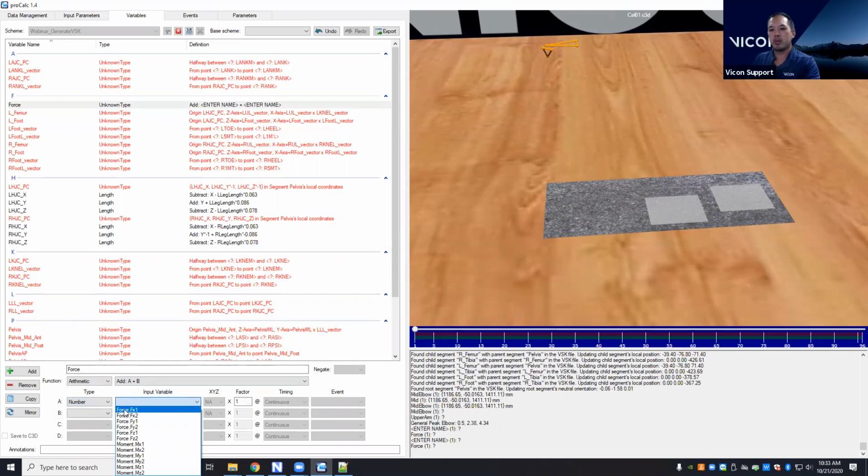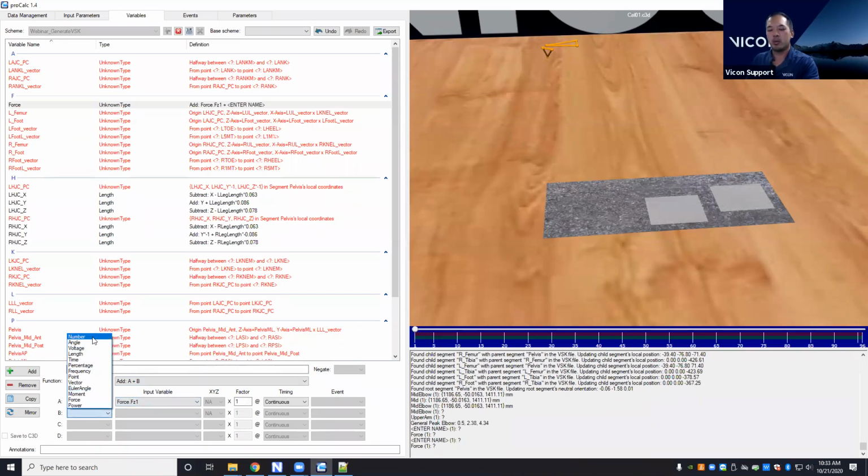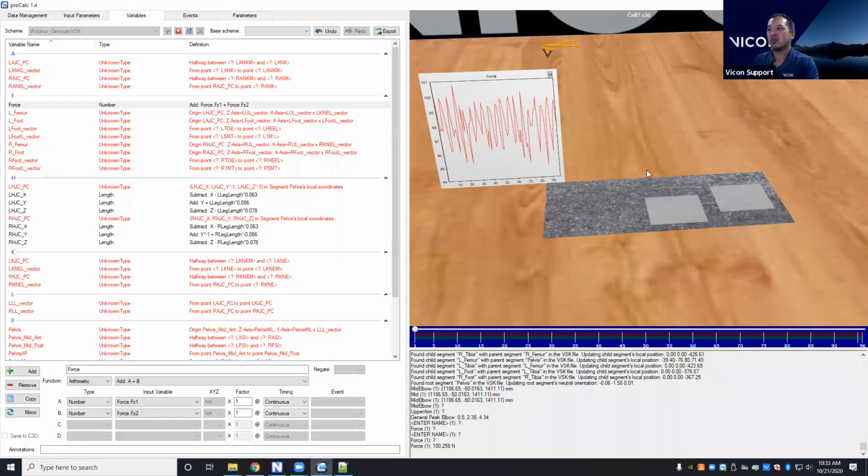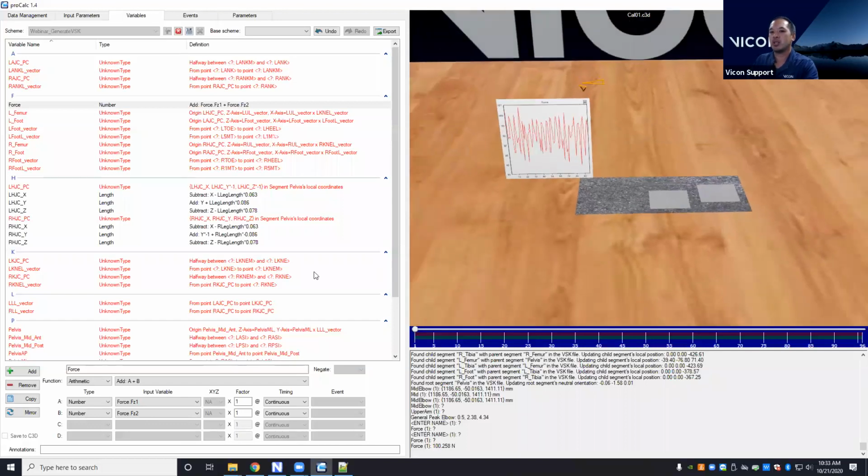And you can see here that I've got my different channels. So I could just look at the FZ, for example. I won't actually have anything to display, it'll just be noise in this case. I don't really have any vectors there, but you can definitely use those in your event thresholds as well. They're just going to be accessible as a number. So again, you're not going to be able to do any inverse dynamics or anything like that, but you can definitely obtain the force values there.